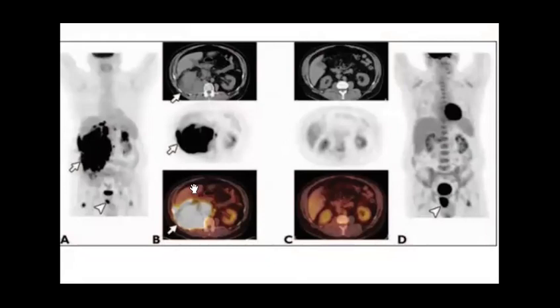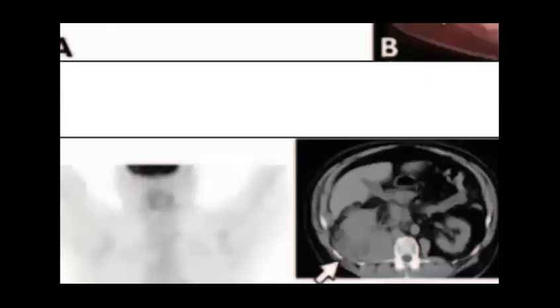Let's go to this case, and you can see that the kidney here is involved. This is a young woman who has something, so try to describe. Is the image clear, or do you want it larger? No. Let's go back. Sorry. It's better.